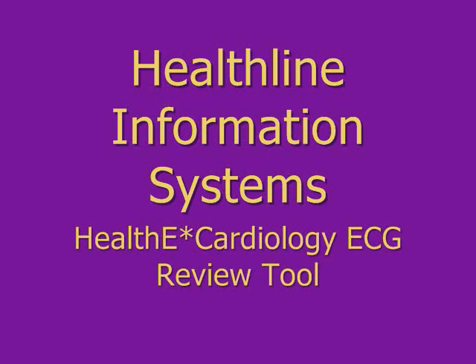HealthE Cardiology is a workflow-based ECG management system that can be integrated with your hospital information system. It natively supports ECGs acquired using the Midmark IQ ECG device and Mortara Eli ECG units. In addition, HealthE Cardiology can work with ECGs that are sent to our system via virtual printer. If your ECG machine can print to a Windows printer, we can support it.